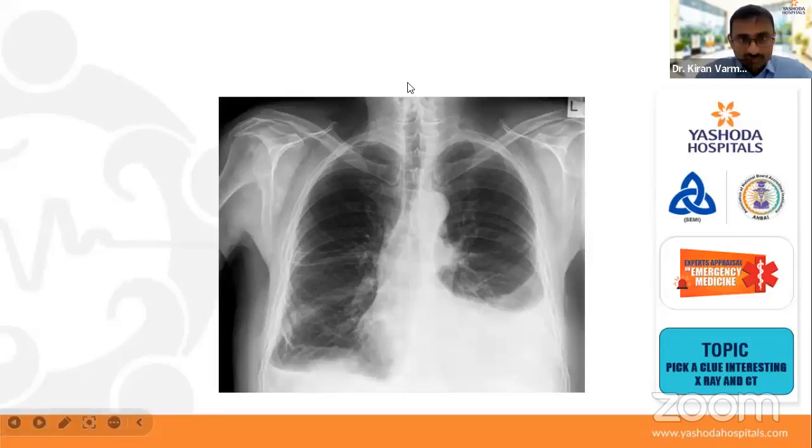We are noting it down. Dull note, no tracheal shift, obliteration of CP angle, superb. Adil Afsal, true. Here bilateral, left more than right. You're right. Yes, we are noting down the overall answers because we have to give 3 passes for the conference, right?